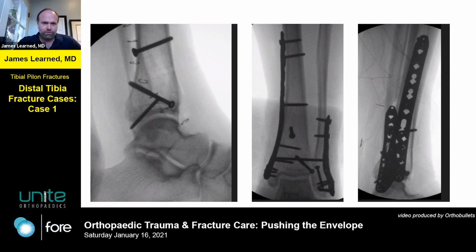And that's sort of the first major reduction that was done, and that drives that medial fragment and the posterolateral fragment back into their anatomic location. And then once that's in place, this cannulated screw, which you can see on the central image here, running through the Chaput fragment attached to the anterior inferior tibiofibular ligament, excuse me. And that allows us to compress that and reconstruct the syndesmotic stability, at least in the front of the syndesmosis. This screw here you can see is a lag screw in the fibula, and then a neutralization plate.